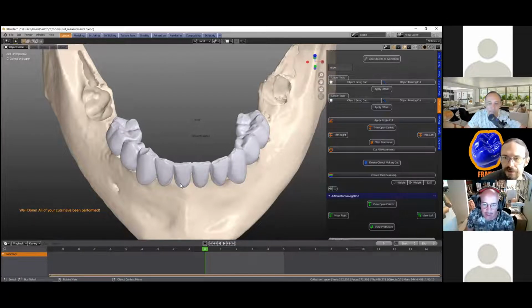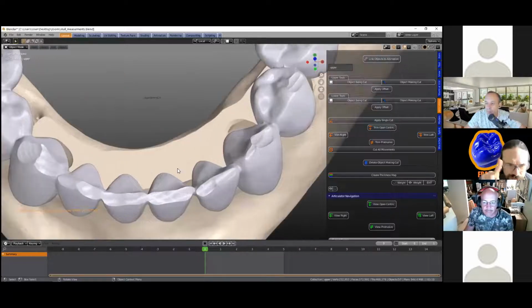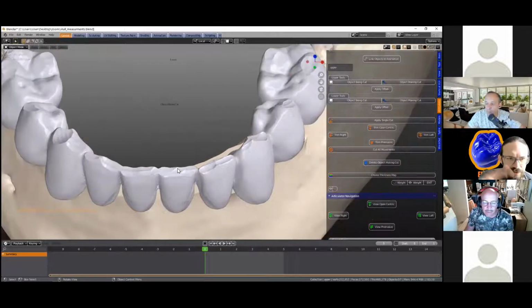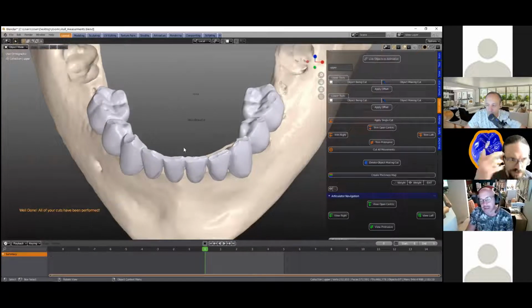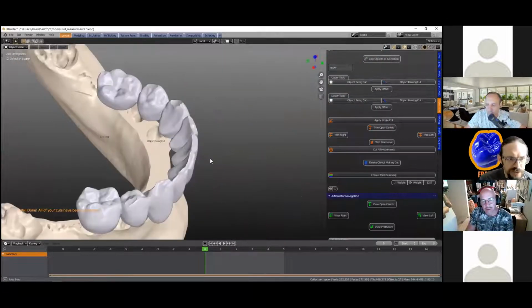All right, so you choose the old-fashioned Boolean cut, not the new implementation for this module. For 2.83 and for all the other modules, it uses the old code. But when you switch to 2.91, it will use a new code, which takes a little bit longer, but not that much longer, and it's more precise and will never get failed Boolean cuts, which is fantastic. You use the new algorithm in the 2.91.